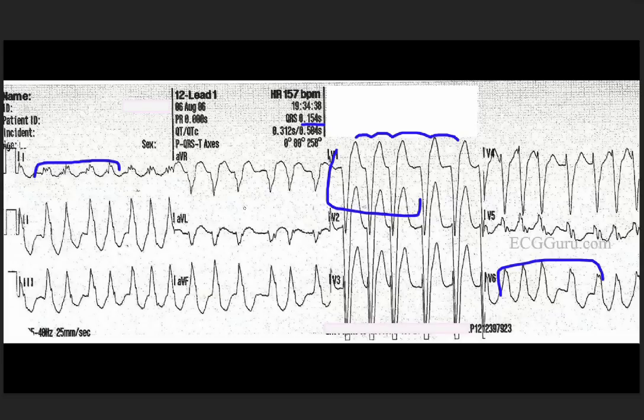So let's say this patient looks very bad. First glance, we think it's VTAC. We actually know now that that would be wrong. It's atrial fib with left bundle branch block. But let's say in the heat of the moment, to us it looks like VTAC and the patient looks really bad. The blood pressure's low, the perfusion is bad, the patient seems to be going down the hill pretty quickly. We need to do something.